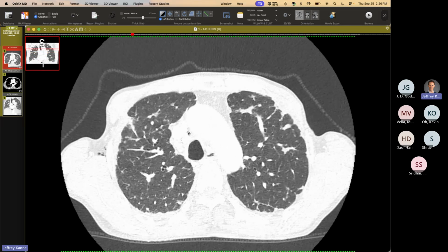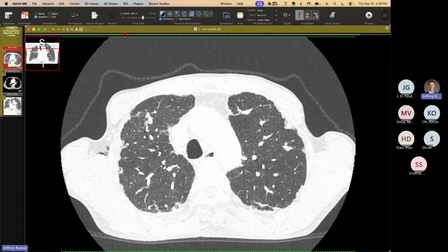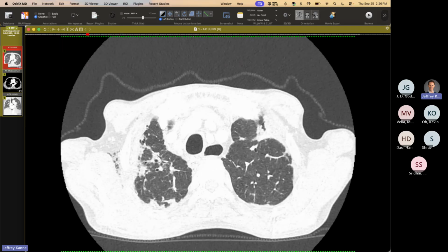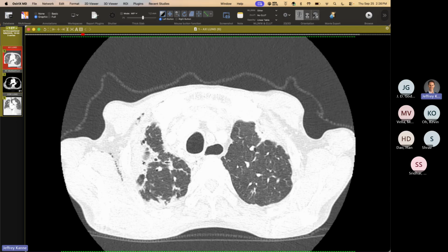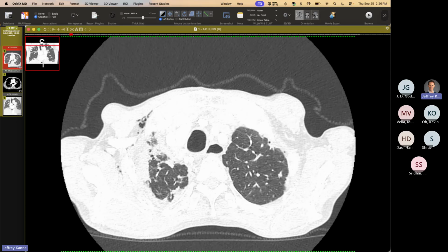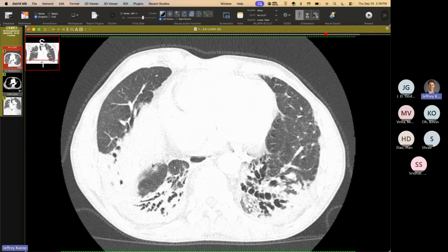some tiny little nodules along the lymphatics. So when I first saw this case, and then he has this dense fibrosis up here, I thought, oh, looks like PPFE, pleuroparenchymal fibroelastosis, very dense fibrosis, some traction bronchiectasis. And then the bases really look like fibrotic NSIP, right?